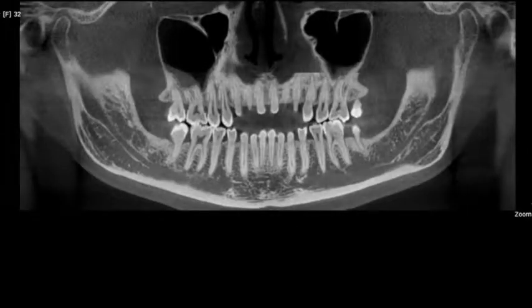Well, we can actually do thin slice pseudopanoramic, when you have software, and some software doesn't allow you to do this. If anybody wants the name of the one I use, I don't have any commitment to it except that I beta test for them. It's called On-Demand 3D, and it's powerful. I'm going to show you I can actually use a virtual endoscope and go in the mental foramen and down the canal and see an implant in the canal. I've done that in 2 or 3 court cases.